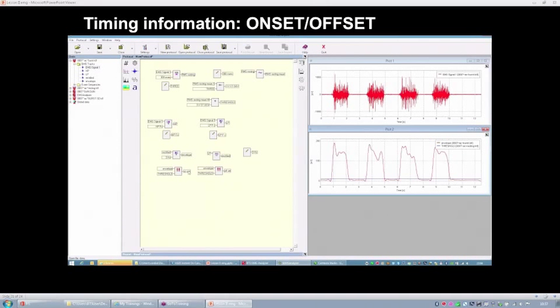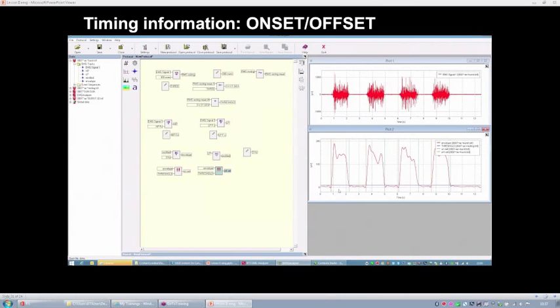So this is a very quick and easy example that you can use to compute the onset and the offset value. In this case, for example, if we have a cycle, we can define a cycle, and we can say what is the duration of the activation period of the muscle with respect to the entire duration of the cycle, for example. And you should already know how to do it if you remember what we did during the previous lesson.